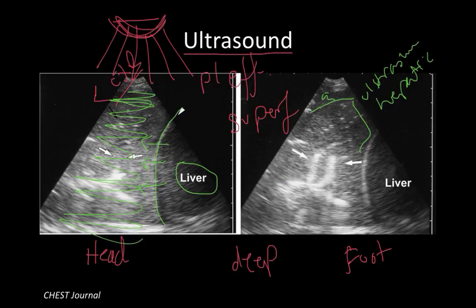And within it, you can see these areas that are brightly lit. On an ultrasound, exactly opposite of a chest X-ray, air bronchograms are bright. If you see air bronchograms, they're going to be white spots and white lines, because air is very echogenic relative to the tissue around it, which is filled with purulent material and fluid. So an image that looks like this is considered consistent with pneumonia, and treating the patient would be definitely appropriate.